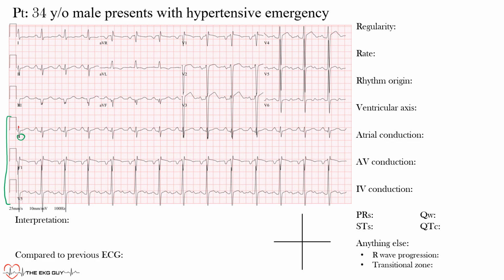So this is an R wave here, and we're going to find the next R wave, which is this one here, and we call this duration or interval an R to R interval. Then we find the next R wave, which is this one, and that's an R to R interval, and then there's one here. So as you can see from all of these R to R intervals, these R waves of our QRS complexes, we look at them all.